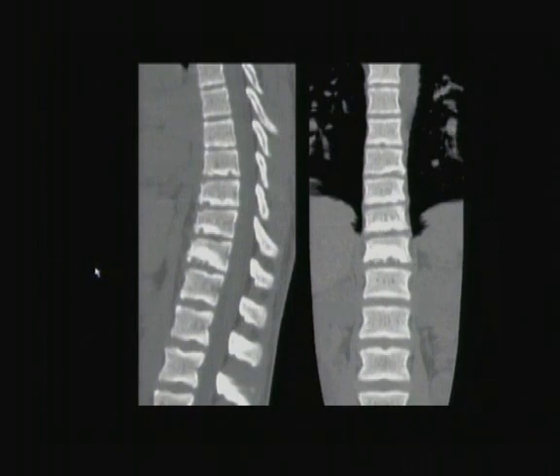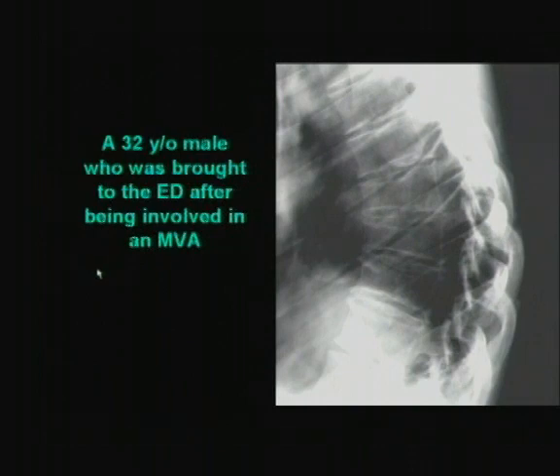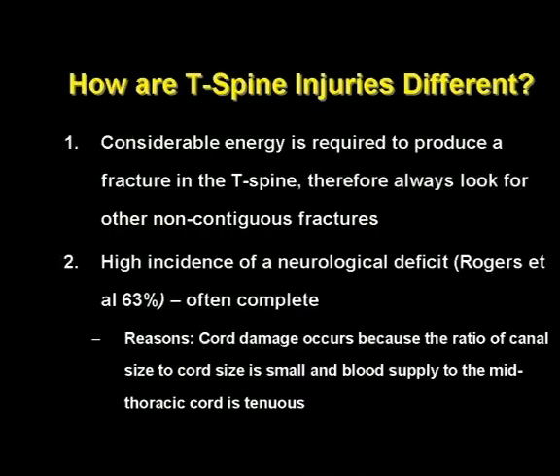However, this could persist into adulthood. And this is an adult who came in the middle of the night after a car accident and had the same problem, and again gave people lots of difficulty. But this is, again, Scheuermann's disease in an adult.